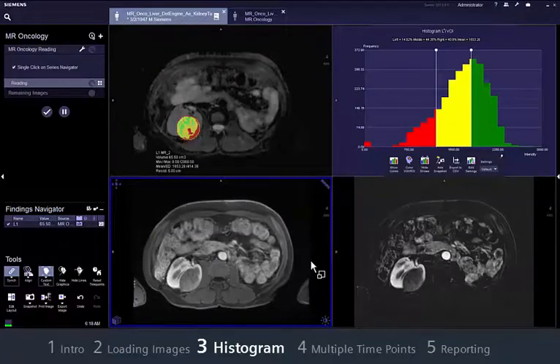Findings can also be tracked over several time points, and a trending plot of the ROIs or VOIs can be created in the Findings Details dialog box. This shows the progress, for example, of the therapy or tumor alteration graphically.